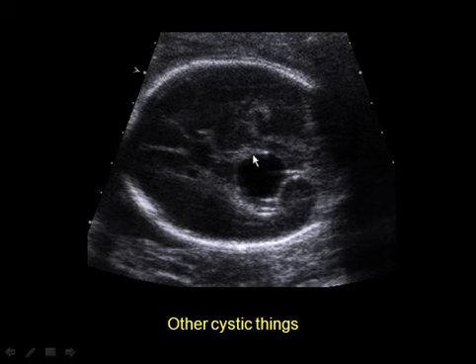Another cystic thing in the brain is this round structure here. It is not in the midline, it's off-center on one side. It's posteriorly and related to the tentorium, seen underneath the temporal occipital lobe region here, and this is an arachnoid cyst.